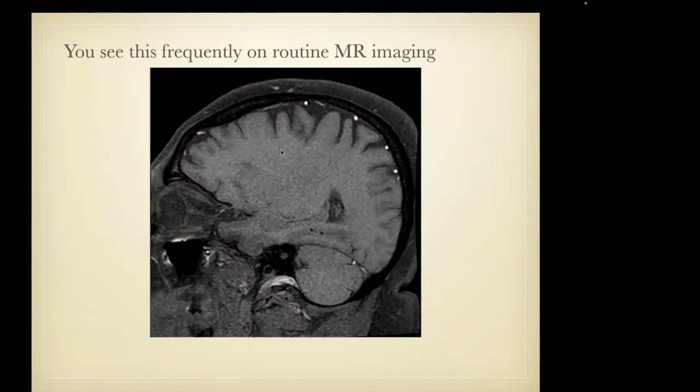And what you notice on this image is you have high signal intensity in the cortical veins, because remember, the cortical veins convey blood flow from lateral to medial, so that these veins are directed towards the superior sagittal sinus. So we have blood flowing from outside of the volume into the volume, and so we see this quality of flow-related enhancement, even though this is not an MRA per se.